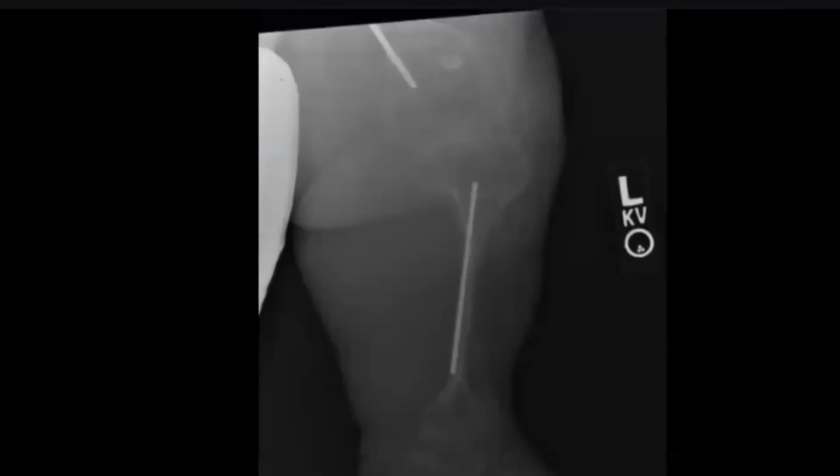All right. So I'm presented with a skeletal survey of a child in an infant age group. I don't know the exact age. However, I can see that there are rods seen in the bilateral femora, and the bone density is reduced, and there is bulbous expansion of the epiphysis noted in the distal femora.